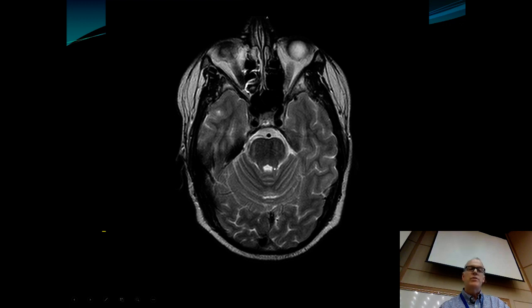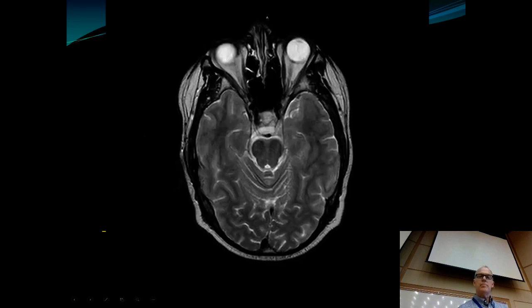Okay, now the fourth ventricle, here this is getting smaller, and so this is becoming the cerebral aqueduct right here. This will have a more classic appearance when we get up into the midbrain. And you can actually make out lots. You can see extraocular muscles and all kinds of things looking at the orbit as well.